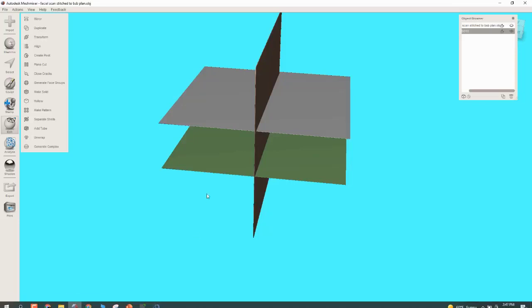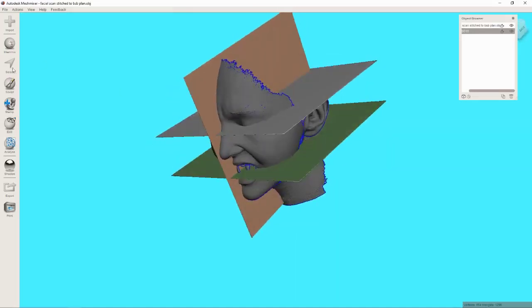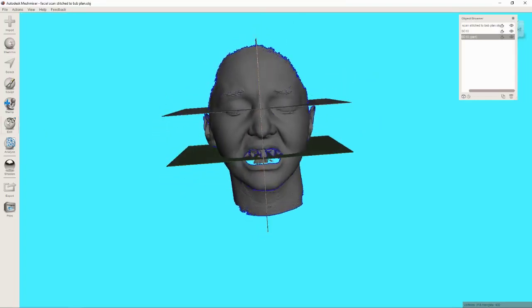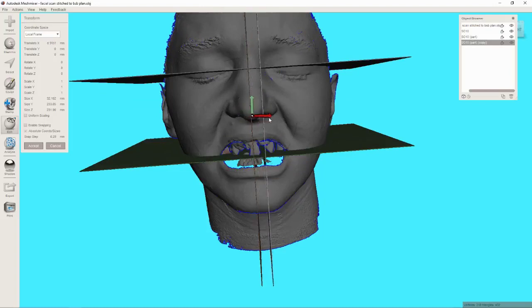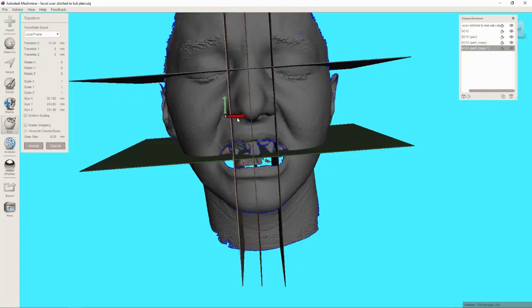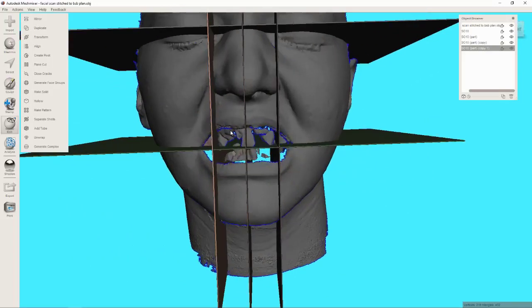Going back to Mesh Mixer, the one other thing you could have done here is for your scaling of the teeth, if you don't want to ballpark it, then while this is still separate, edit, duplicate, T for transform, pull one over this way, width of the nose, accept that, duplicate another, T, width of the nose. Alright, and I really probably should have done that, but now when you're dropping this thing in, you're scaling that, you're trying to scale canine to canine to fit right here.